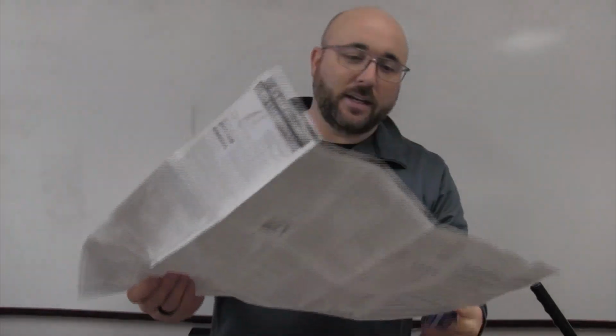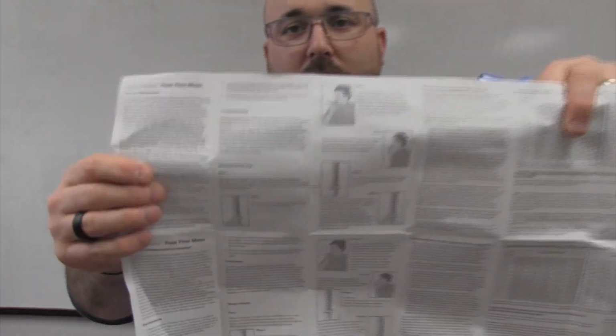Let's go next to our diagnostic kind of device that we're going to look at in monitoring asthma. That is the peak flow meter. Oh, the joys of the peak flow meter. So it comes with a massive handout. You can see a trending tool over here. This is like, I mean, overload. If you give that to a patient, it is like reading something from a medication. So it has a lot to it. What your patient really needs is somebody who specializes in asthma management to discuss this with them.